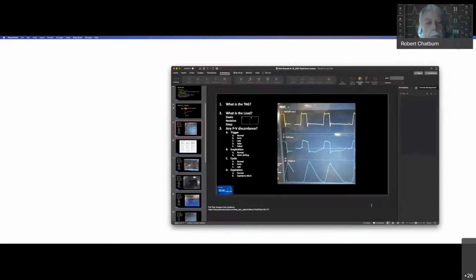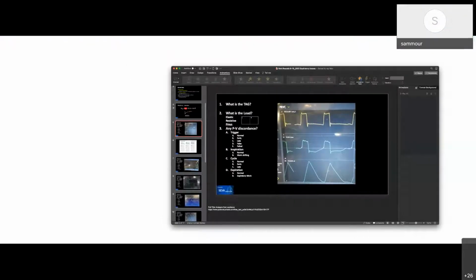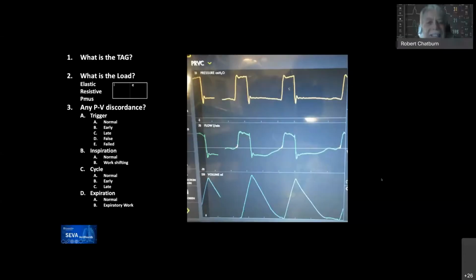You should have really removed the tag up top. Well, that also is a clue, right? Yeah, you can't really tell otherwise. So I'm going to go with ignoring the tag, just looking at the waveform. Since the pressure waveform is more square, and flow seems to be more of a passive participant, this looks like pressure control.